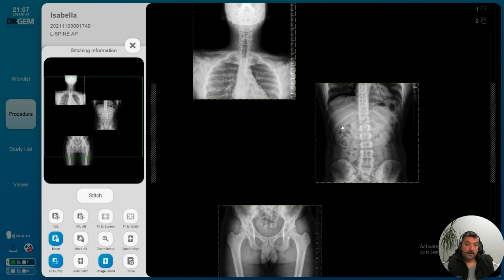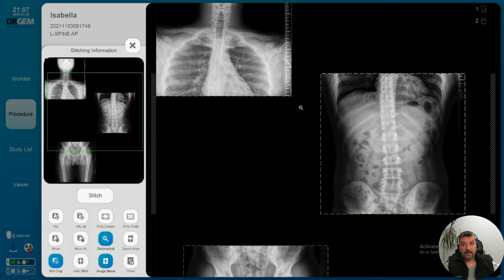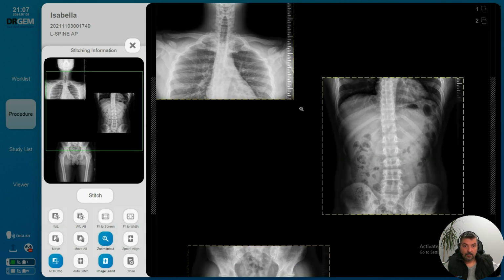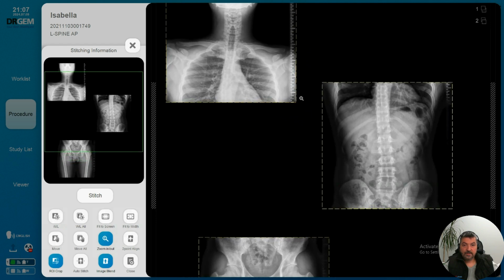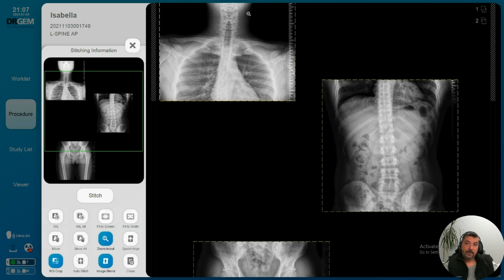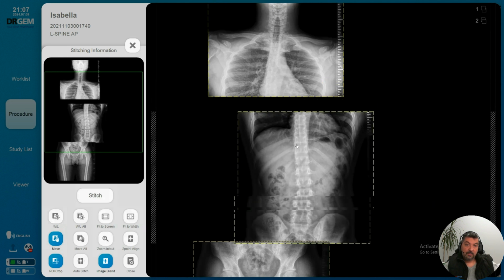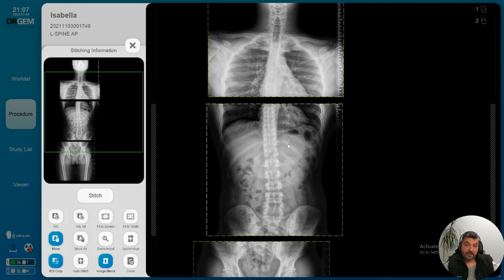as to what's going on. Right, so once you're in the stitching window, you have your tools on the bottom left-hand corner here. Generally, what I suggest to people is use the zoom in and out. So click on that and zoom in by scrolling up, or left-clicking and pushing up to zoom in, pulling down zooms out. So we just want to zoom in. We're interested in the top two images. That's the first ones that we're going to stitch. So we're going to keep the first one in position by using the move button here.